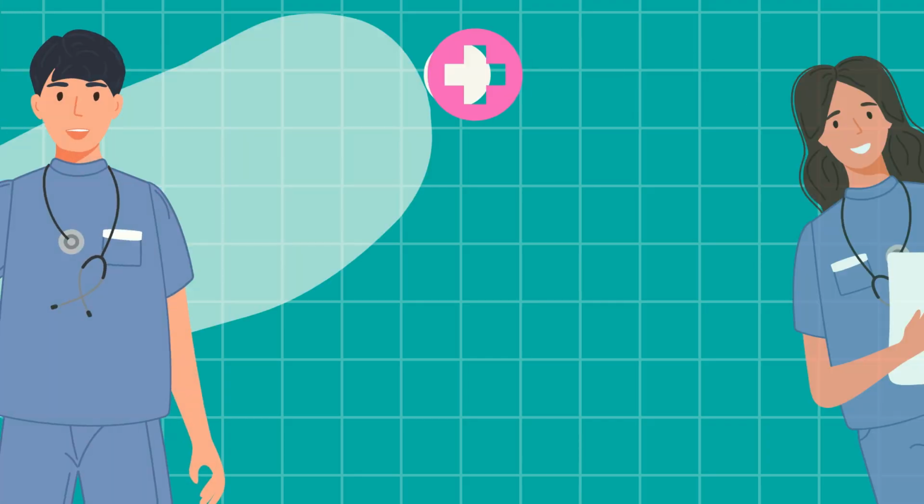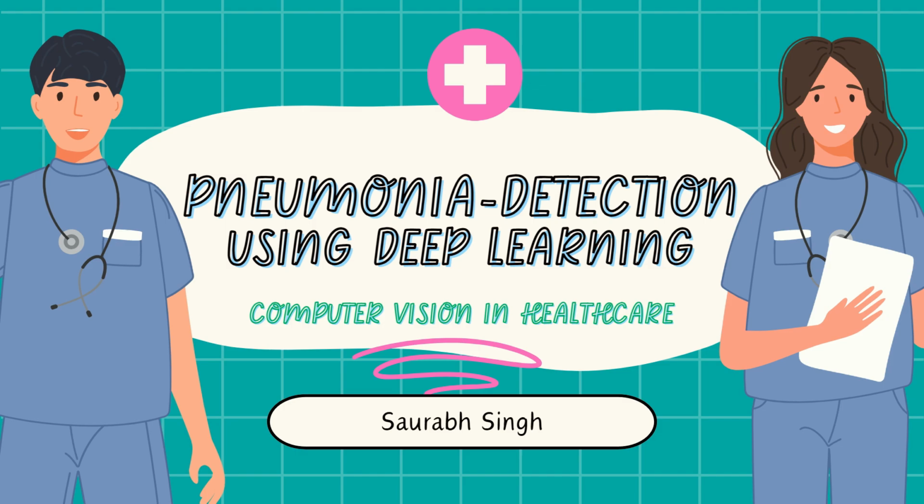Hi, I am Saurabh Singh and I have built an AI system that can detect pneumonia from chest x-rays in under 2 seconds. But here is what makes it special. It does not just tell you yes or no, it can actually show you exactly where the infection is on the lung. Over the next few minutes, I will show you 6 different AI models working side by side, give you a demo, and explain how we are pushing the boundaries of medical AI. Let's get started.